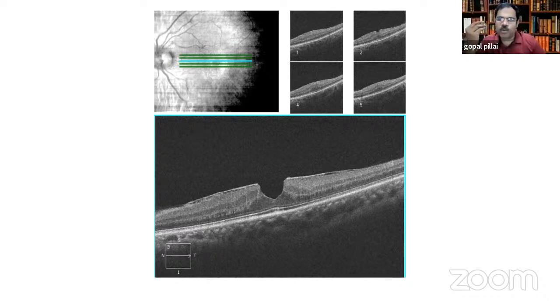See, in an epiretinal membrane, usually the vitreoschisis or PVD would already be there, and that vitreous may be significantly elevated. So we will not be able to capture it in this small area. This is only some 1,000 microns from the retina to the top of the scan, so it may be beyond that. Then we have a thick hyperreflective membrane which is not involving the fovea, right? Yes, but it is exerting traction on the parafoveal area on both sides.